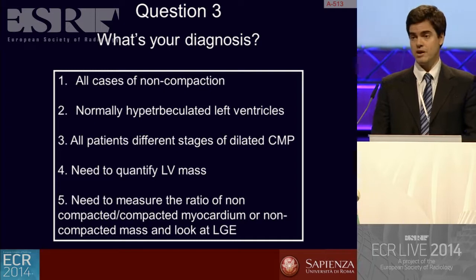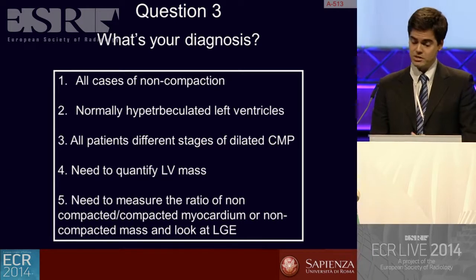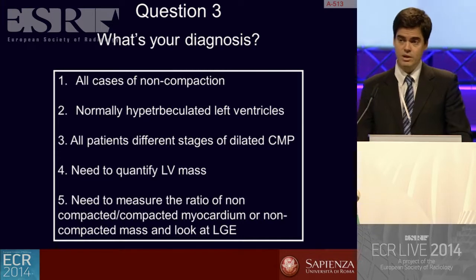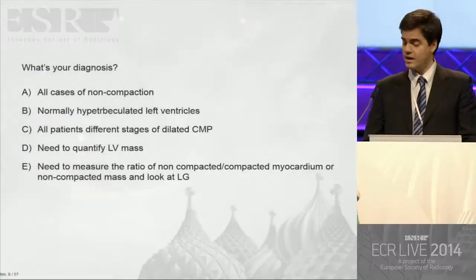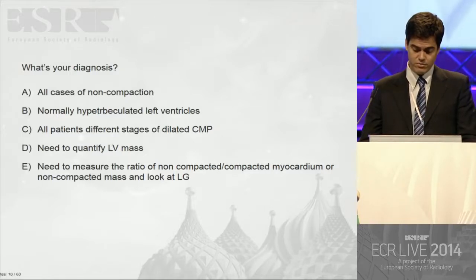We need to quantify mass of the left ventricle. We need to measure the ratio of the non-compacted versus compacted myocardium and to look at late enhancements. How would you deal with such a clinical presentation? And again, let me get back to the cases so you can review what we are talking about.